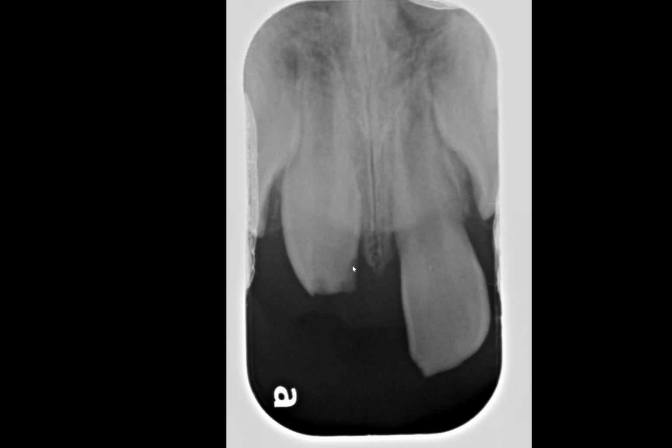Comparing this location of the crown, it should be clear to all of us that this once was located here, and then it's been intruded quite a bit into the alveolar process. Additionally, I want you to note the overall thickness of the dentin at this stage. So again, this occurred about a year ago from today.